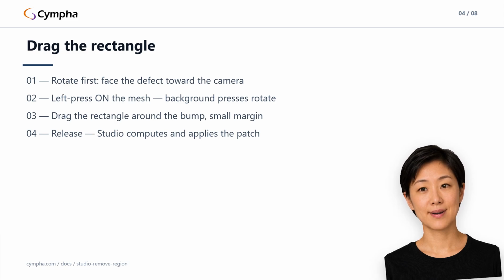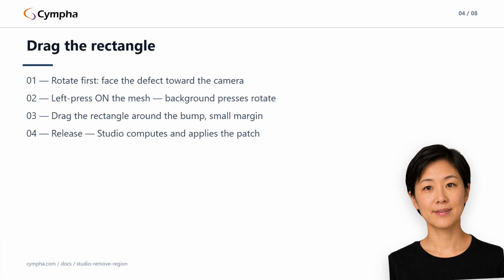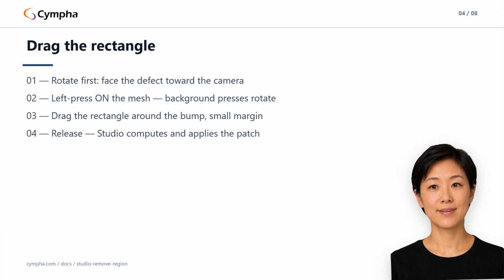On sizing, enclose the bump with a little margin around the visible footprint, and no more. Don't drag a huge box to be safe. The larger the rectangle, the more surrounding real anatomy gets rebuilt or blended into the patch. Small and honest beats big and cautious here.